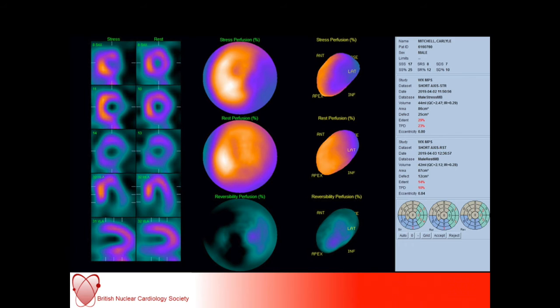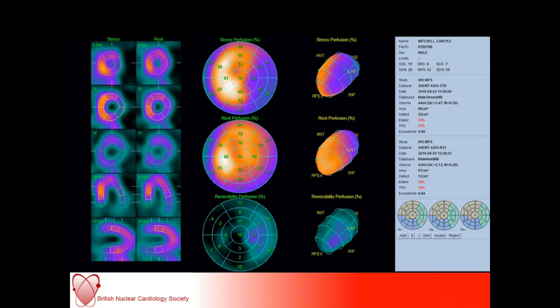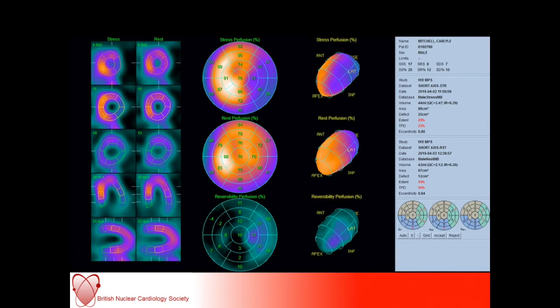If you look at the bullseye picture, you can get an idea of exactly how much the heart is affected, and you could even use a segmental approach and say, well, that's possibly 2/5 of the heart, and maybe 20% ischemia based on just eyeballing it. Or you can overlay the percentage or relative uptake according to the hottest pixel. Here the hottest pixel is somewhere in the apical septal segment. All the uptake is scaled back at stress and at rest, and you can derive a scoring system based on that: mild, moderate, severe scoring.